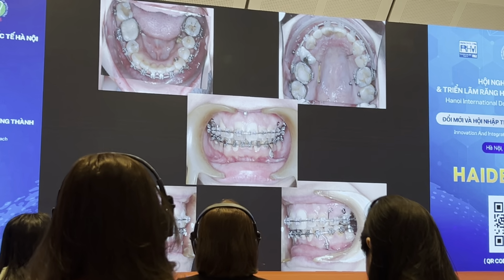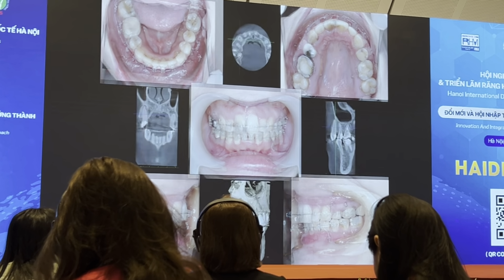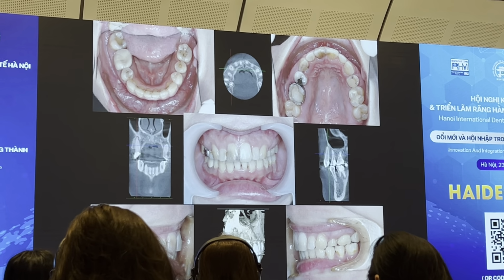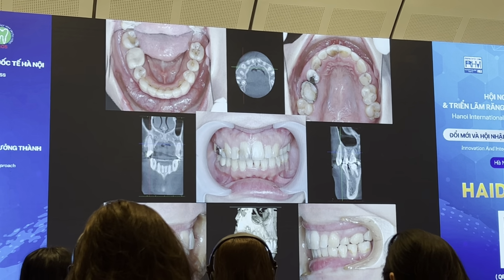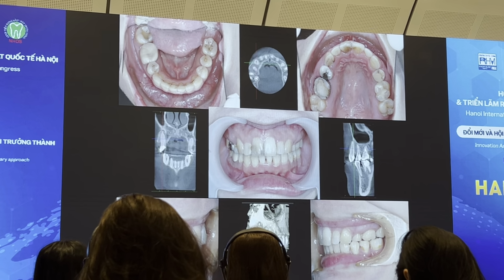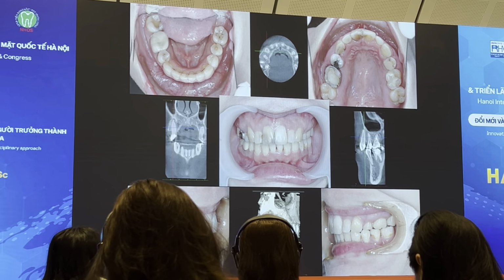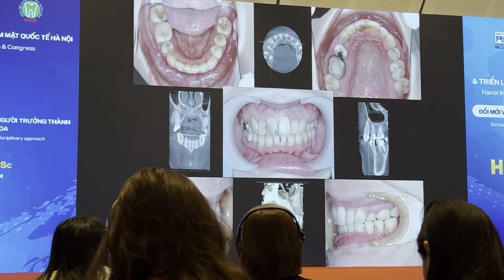This was the patient before the bonding, and this was the patient 1 month after the bonding. From the CBCT, we could see that the root of 1-3 had been brought inside the bone buccolingually and was separated from the root of 1-5 mesiodistally.